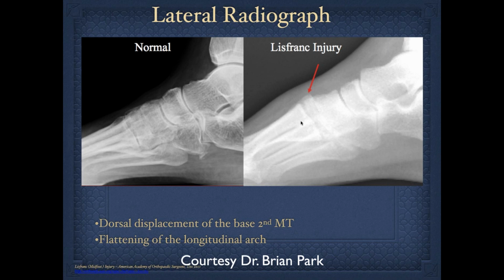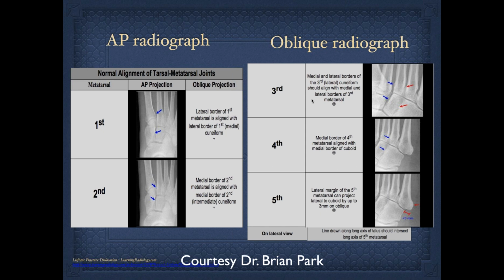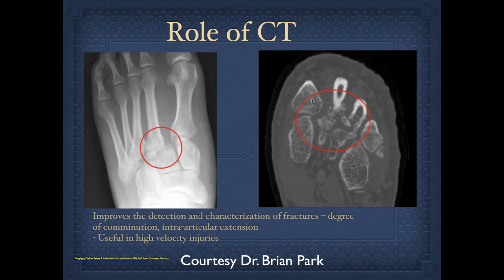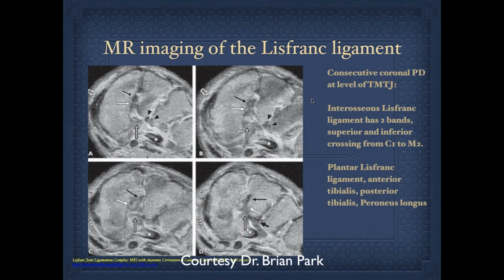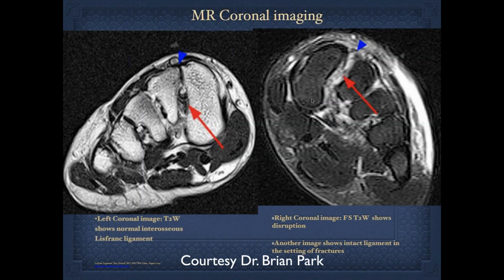If you don't have an MRI, the best thing to do is X-ray the other foot. And here we can see there's instability with dorsal displacement of the second metatarsal base. More severe injury. I don't think we need to keep going through all of this.